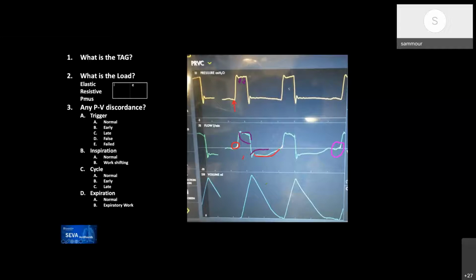Well, my answer to that would be two things. One, if it was a high resistance, you wouldn't get a very high peak flow. The peak flow is relatively high, particularly relative to the peak expiratory flow, which is another clue. And the other thing is, how often do you see a patient making a fairly significant expiratory effort but no inspiratory effort? Patients like this are hypoxic or anxious, and so they're breathing in and out, in and out. So I guess it's a common clinical observation. That's the way I would think of it.